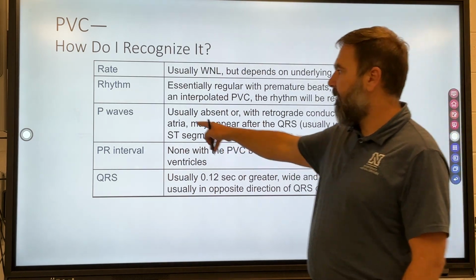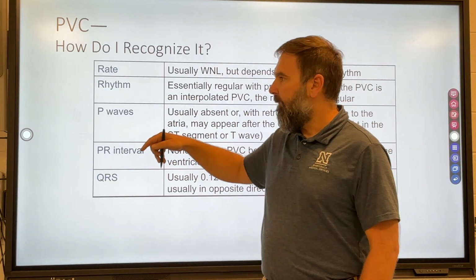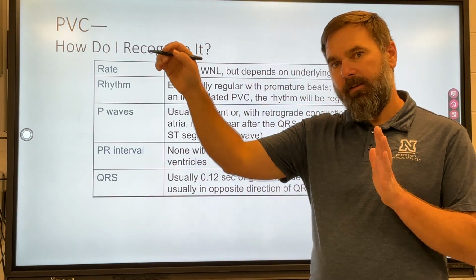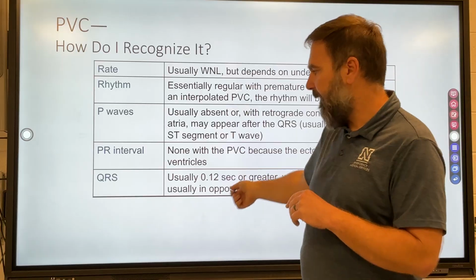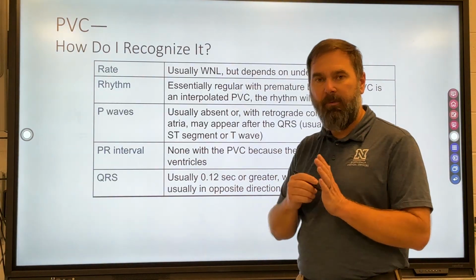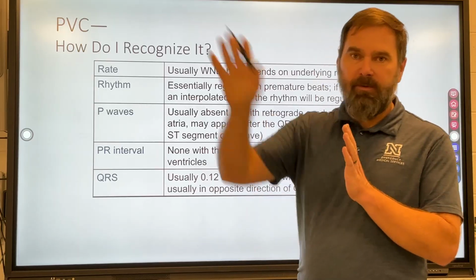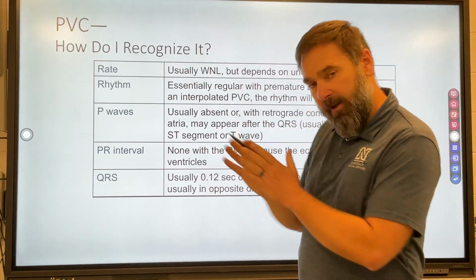So we talked about how the PVCs look. P waves and PR intervals do not exist with PVCs. Now, if you remember back from junction rhythms, how you have retrograde P waves. The same thing would happen if an ectopic site in the ventricles decides to stimulate the contraction. The impulse is still traveling up toward my right shoulder, still following the same pathway.